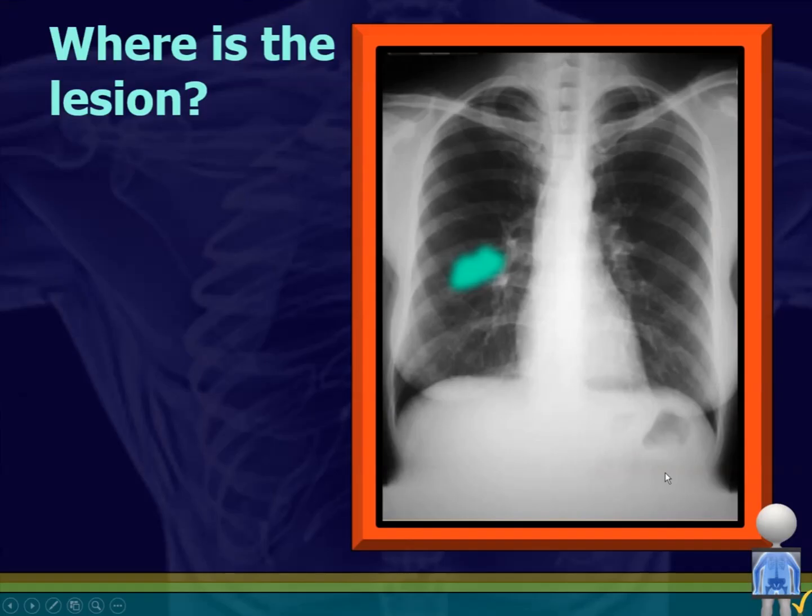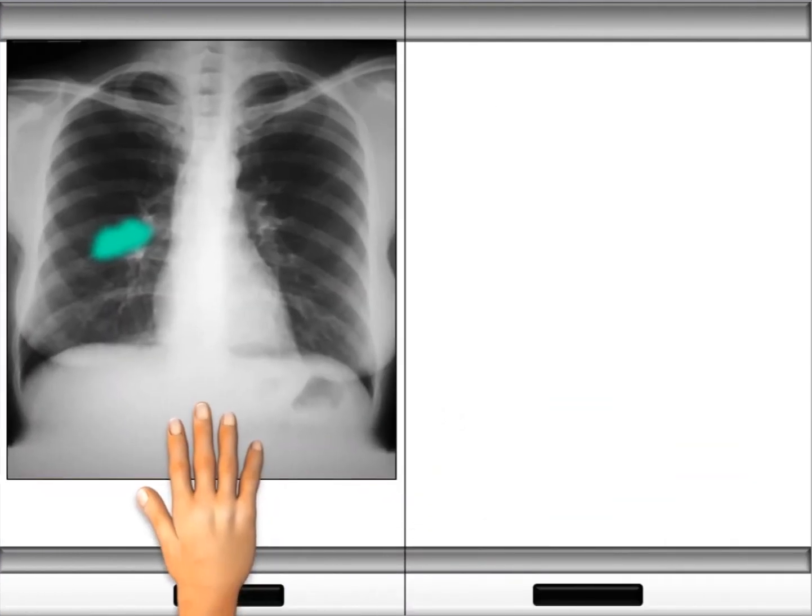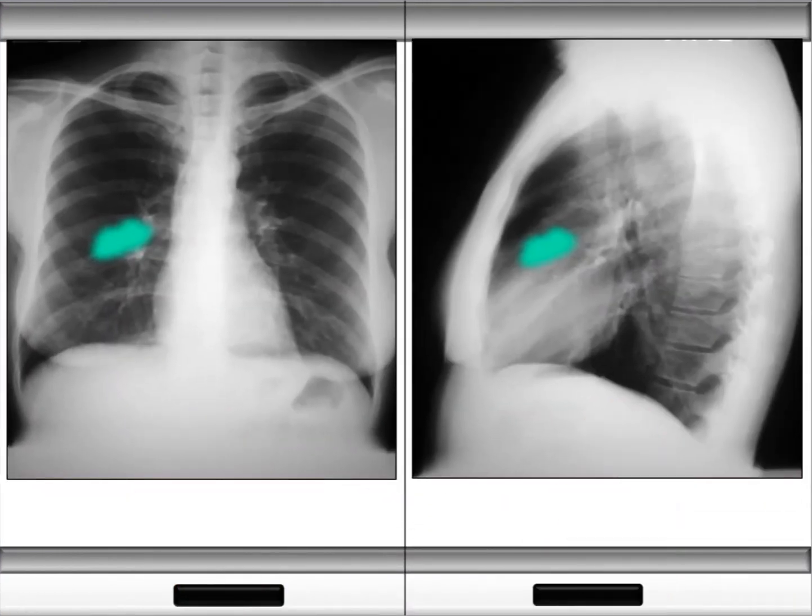Now, if you looked at it again, and let's say it was a right middle lobe lesion, although it might be difficult actually to see this with the heart on the right side, then it would be here, correct? So you can take your film from the other side if you need. If you're worried about right pathology, that way you don't have to worry about the heart occluding it. But just for the sake of explanation here, you see now I know this is a right middle lobe as opposed to a right lower lobe, and again I couldn't tell by looking at the frontal projection.